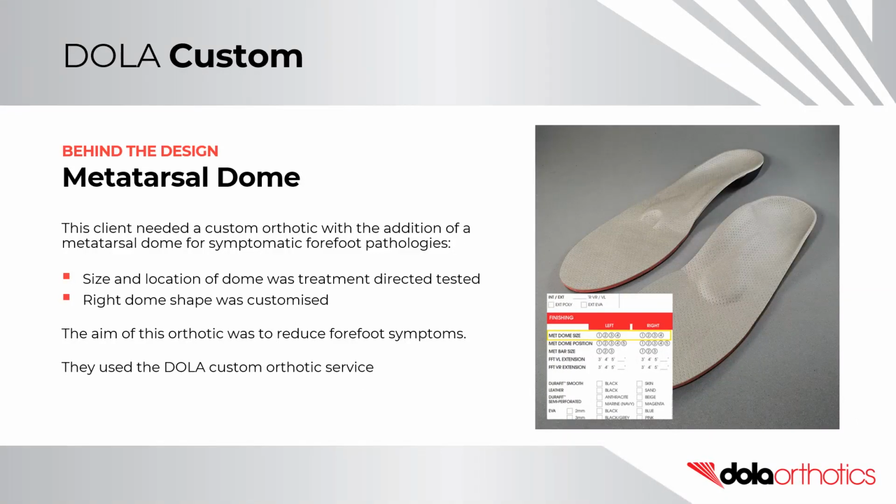Behind the design, metatarsal dome. This client needed a custom orthotic with the addition of a metatarsal dome for symptomatic forefoot pathologies. They chose the size and location of the dome via treatment-directed testing of a prefabricated metatarsal dome. The right dome was also customised with a cutout. The aim of this orthotic was to reduce the forefoot symptoms.